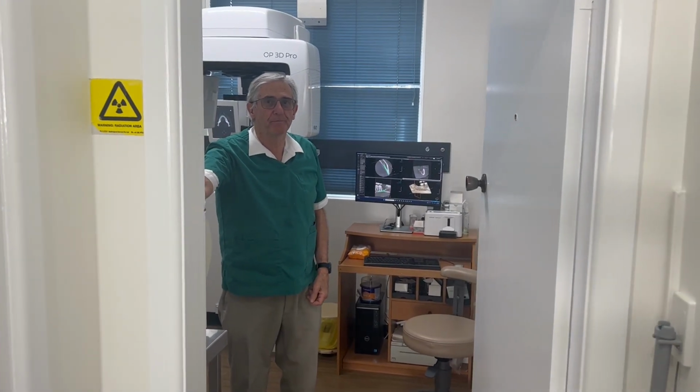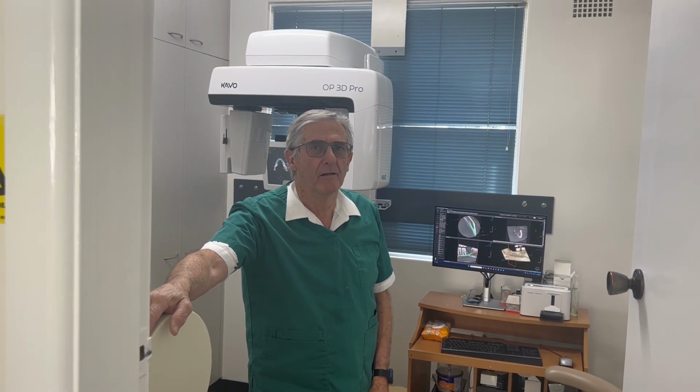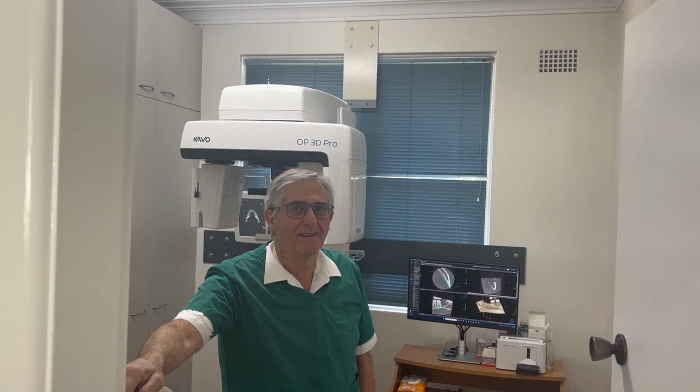We're here today at North Richmond Dentistry and we're talking to Dr. Steve Cross, who is using the OP3D Pro.